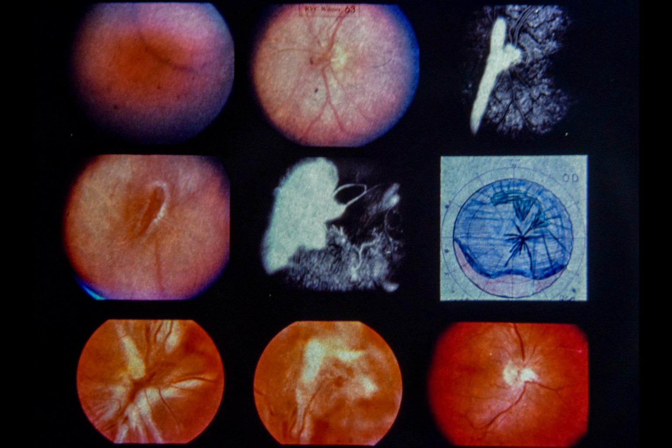Center left, note stalk of elevated retinal neovascularization, left eye. Directly center, note dye leakage from stalk of retinal new vessels. Center right, drawing of right fundus after clearing of vitreous hemorrhage shows extensive traction detachment with fibrovascular stalk emanating from disc. Photographs of this fibrovascular stalk are seen lower left and lower center. Lower right, note shrunken fibrotic membrane on right disc following vitrectomy with intraocular cautery of disc neovascularization performed by Dr.